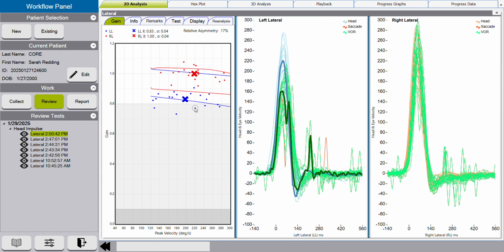Whereas when it comes all the way back down and then it peaks out again a little bit later, at about a little over 200 milliseconds, you're going to see it peak up there again. That is an overt corrective saccade. So this is a good example of both.